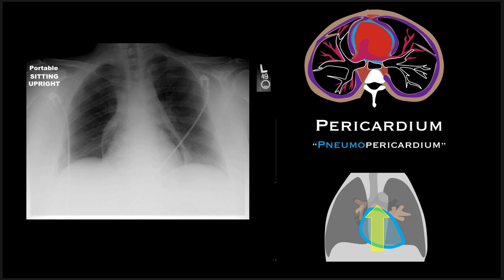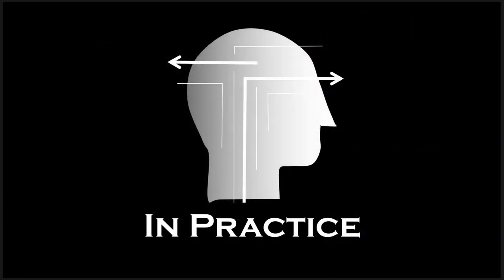So the thing that's helpful is the presence of air around the heart that does not extend above the level of the ascending aorta. Air in the mediastinum typically is not restricted like this, so you'll see little dots of it sort of rising up given enough time. And if you're not sure, we'll have some problem-solving strategy, and we're going to talk about that a little bit later here in the lecture.